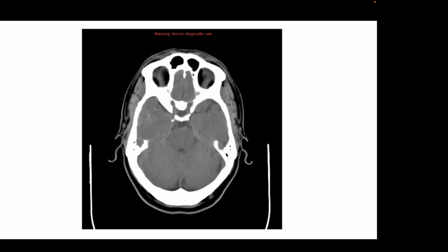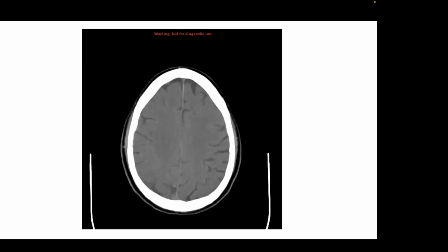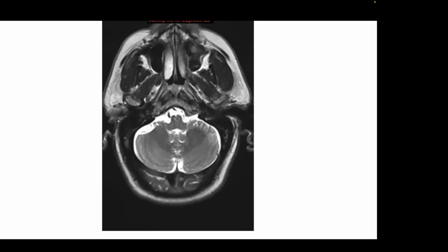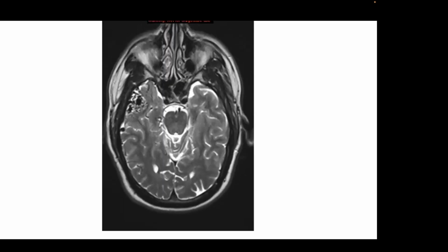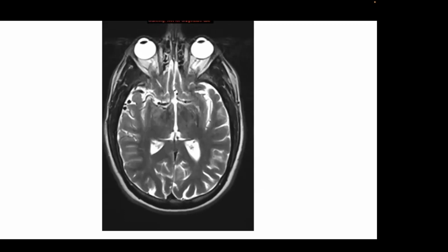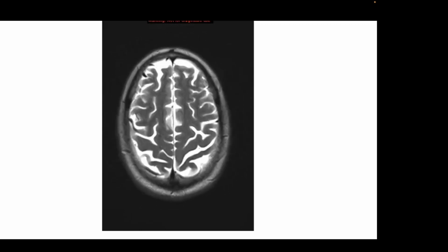So again, in this case, where you have a reasonable history, in this case probably a new seizure with this kind of unusual behavior, you should go on to an MR scan. You don't have to do a digital subtraction in every case here, but I think this shows you the increased sensitivity of a good quality MR scan in a circumstance like this.